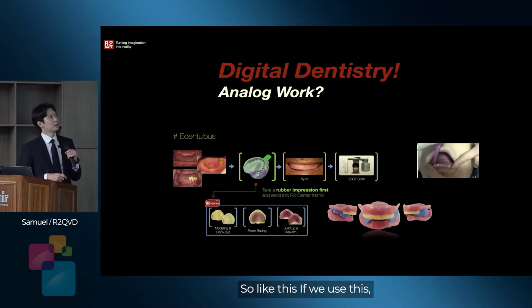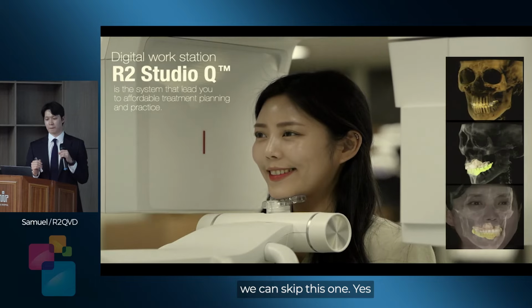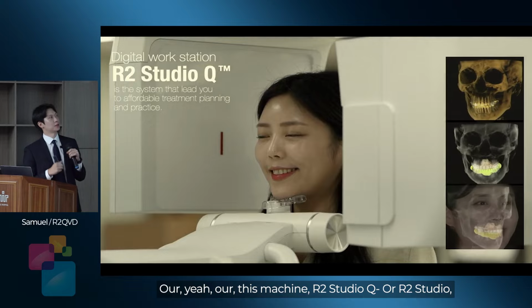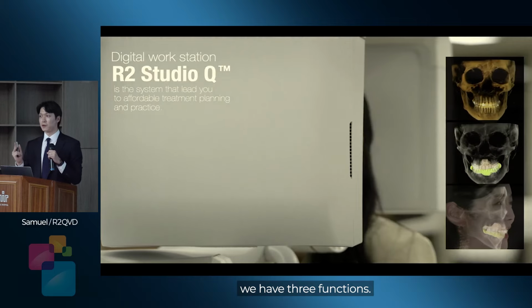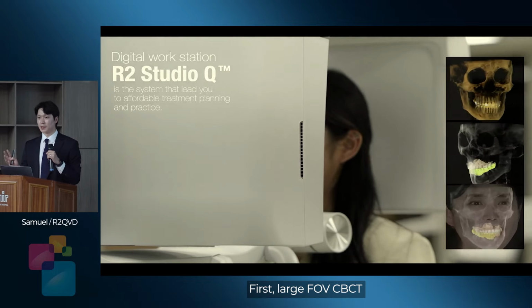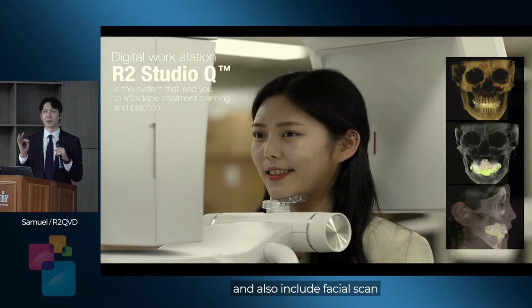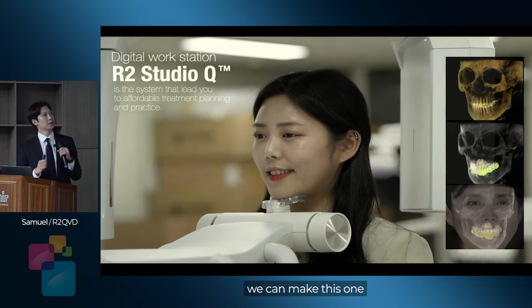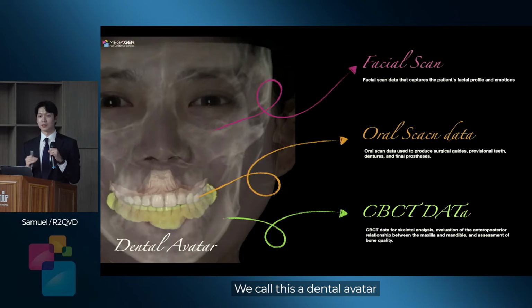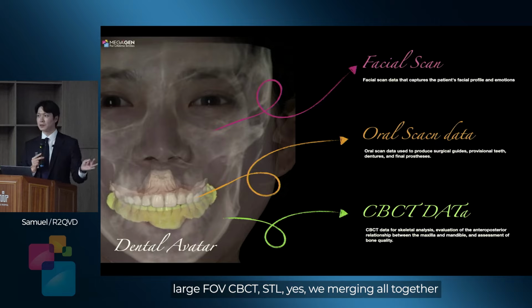So if we use this, we can skip this one. This machine, the R2 Studio Q or R2 Studio, has 3 functions. First, large FOV CBCT. Then we can do impression scan, and also include facial scan. So through this, we can make this. We call it the dental avatar. So facial scan, large FOV CBCT, and STL, we merge all together.